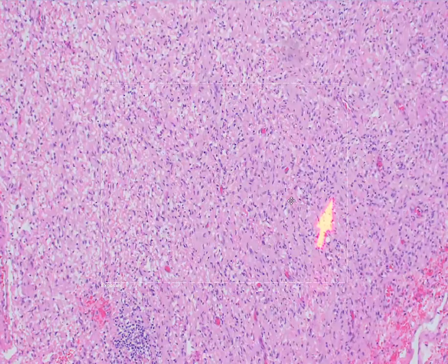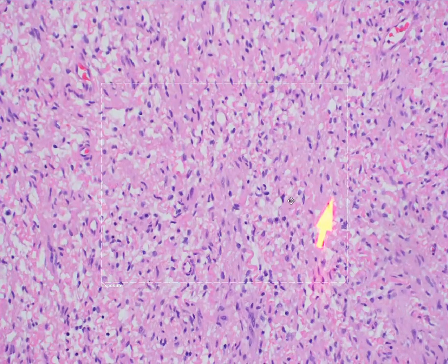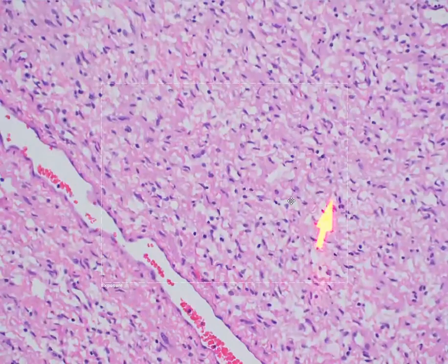So once again, Antoni type B areas look very distinct from Antoni type A, as you can see.